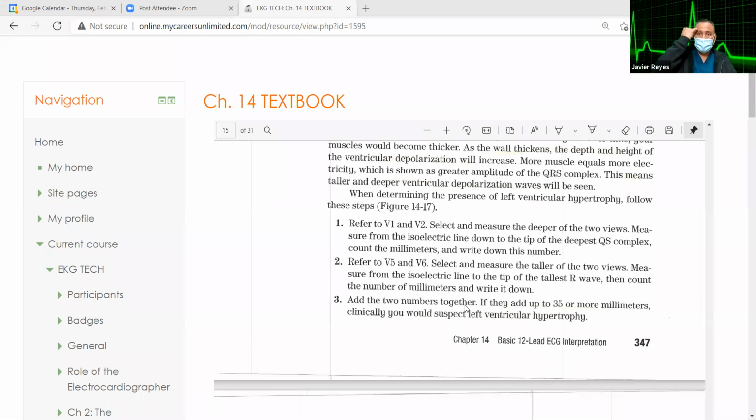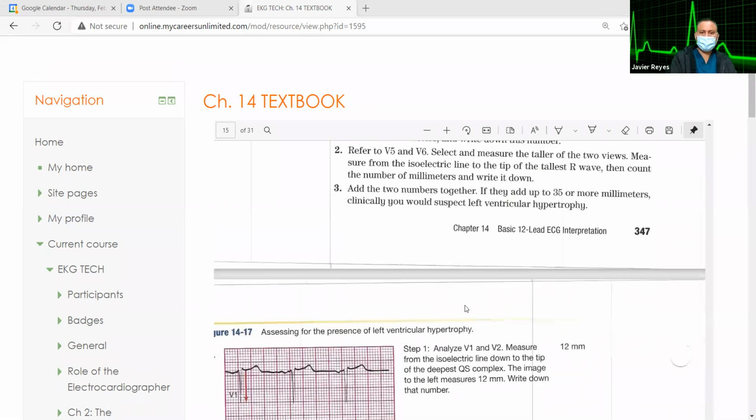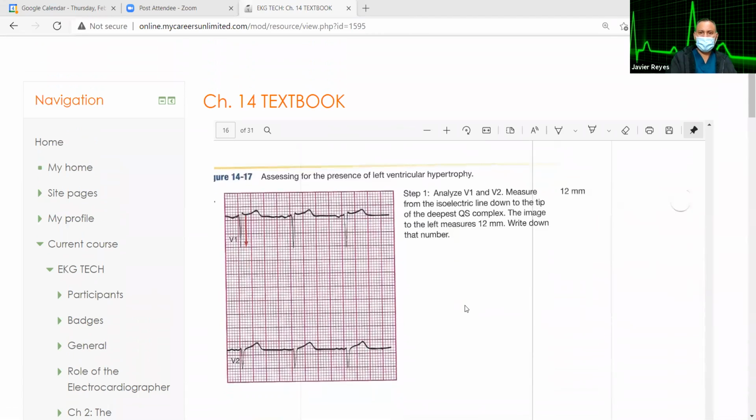And then there's another page because one is the front and the other one is the bottom. So that's making them match. Right there. Right here, then you go.